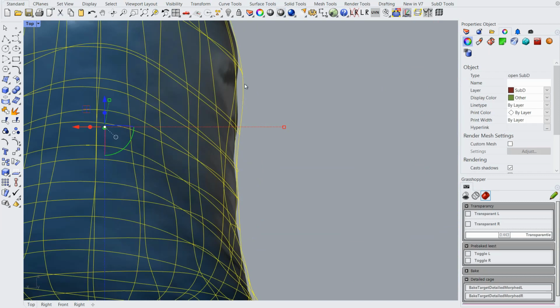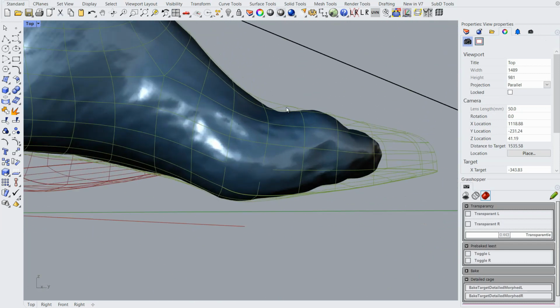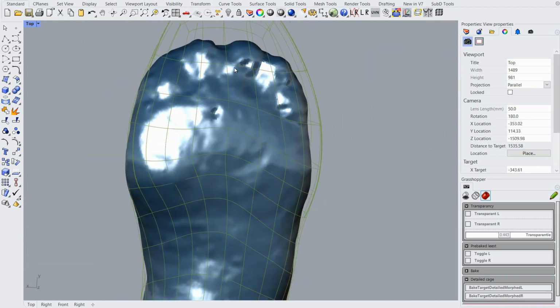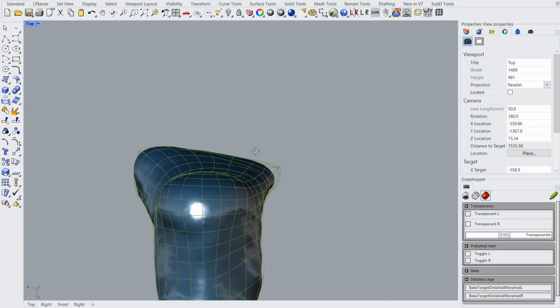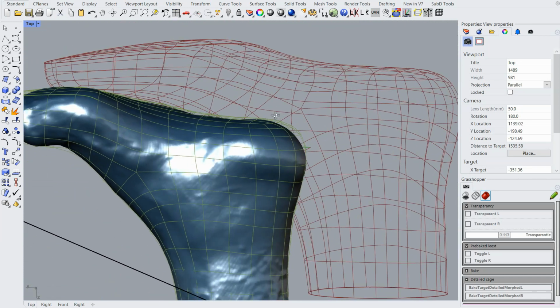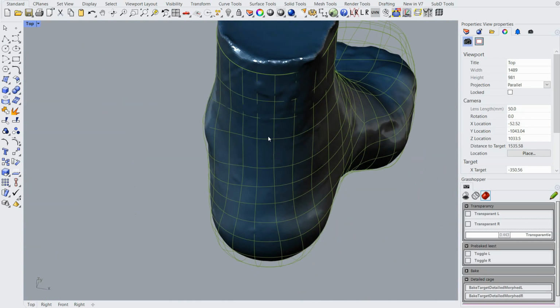Here, underneath the ankle. This is a bit smoothed out, and so are there. And here's extra room for the toes. It's a very pronated last. That means that the lateral side of the foot is much higher from the floor than the medial side. There's some extra room here behind the heel. So there are different features that a good orthopedic last needs to have.